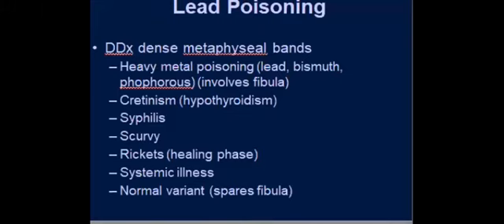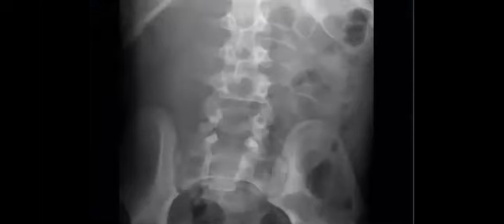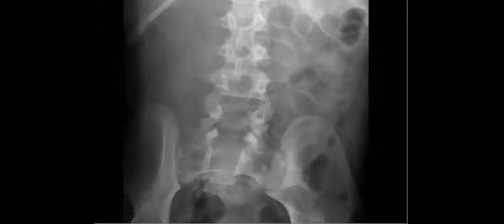Let's shift to this one. Sometimes the pathology can be the dilatation or the gaseous distension. Sometimes it can be the absence of gases, right? Do you agree with this? Spina bifida. I agree that there is something here as a normal variant. But where is the absence of gases here? Right side of the abdomen. Yes, right side of the abdomen.